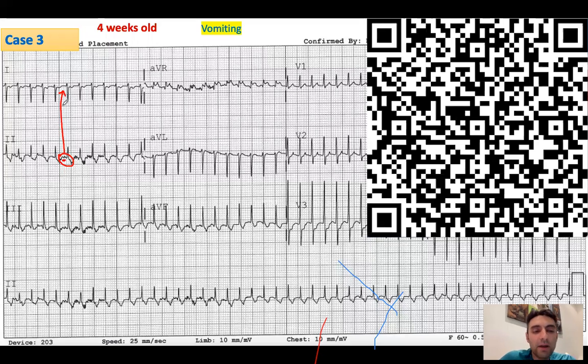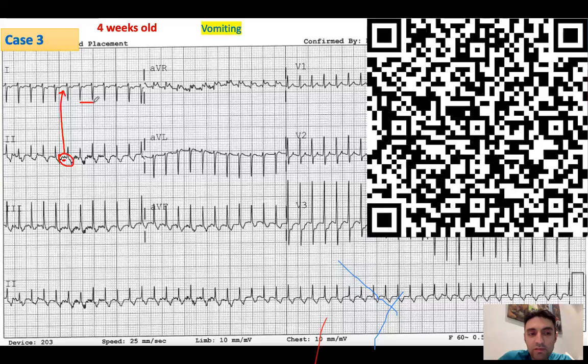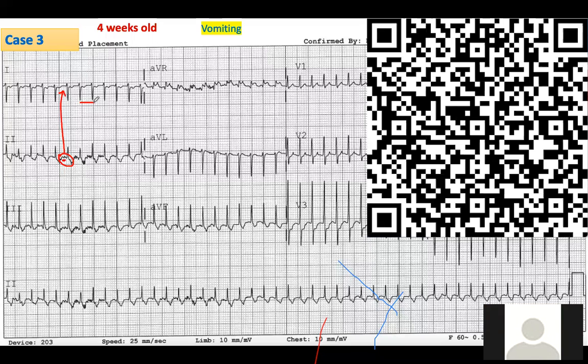The ECG is not very clear, right? The heart rate is about 240. Sinus tachycardia at 240 is almost impossible. Usually it has to be below 220. I don't think it's possible to get sinus tachycardia at 240. The heart rate is against your diagnosis. Plus, this is just artifact.